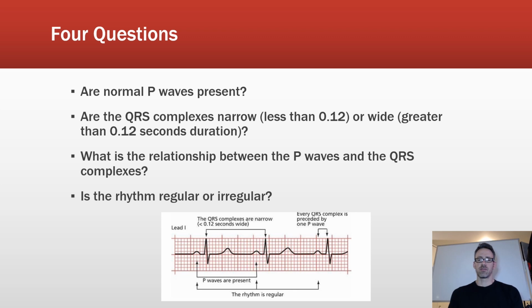And then finally, probably the biggest question: is the rhythm regular or irregular? Again, that's going to take looking at that rhythm strip and seeing if every time these complexes are formed, are they formed at regular intervals or not?